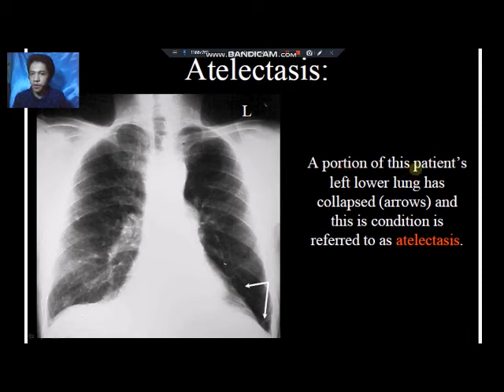Okay, so a portion of this patient's left lower lung has collapsed. But this is the left side of the patient. Siya. And this condition is referred to as atelectasis. So diba, supposedly, ang itsura sa lungs ni patient is paana. That then, because of the condition ni patient, na ay problem sa iyang lung fields, so nag-collapse ang iyahang lungs. Okay, so that means this portion is nawala na, diba? Nag-collapse na siya, nipadulong na siya dito dapit nga side, no? Mara na siya na-compress towards this side.